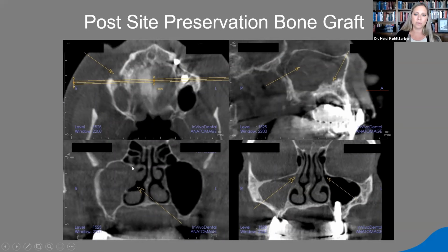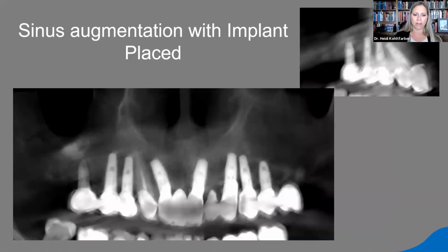Well, our ostium was blocked, and so the sinus started to expand. And that's that mucocele where the sinus is acting like a pathological cavity in and of itself. We have displacement and erosion of cortical borders. Obviously, this has to be a team approach to fix this for the patient, along with ENT. So again, really want to have a good team on your hands. But this is a very bad day for everybody. But these things do happen, so we want to plan accordingly.